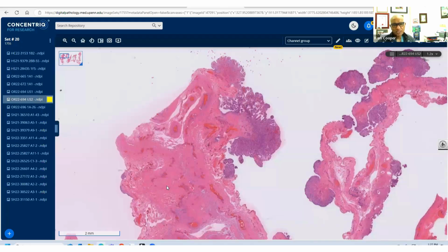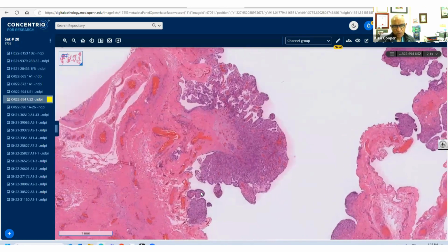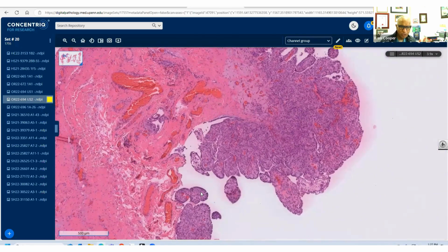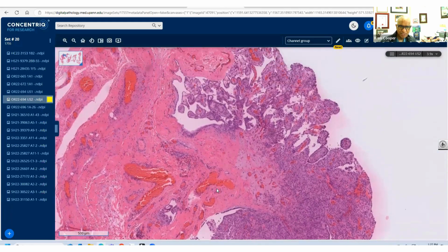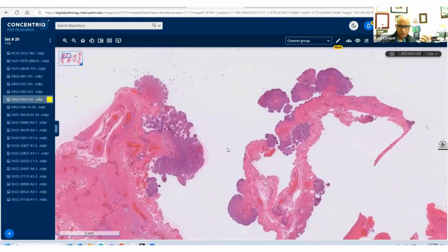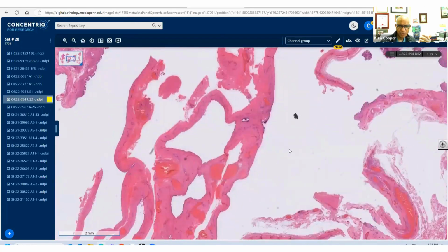And they do very well, and that's why they took away mesothelioma and they call it tumors. And the WHO now calls them tumors instead of mesos. So those are clearly morphologically and geographically distinct. So this in turn is in the hydrocele, multifocal, and you have all these papillary excrescences all over the place.